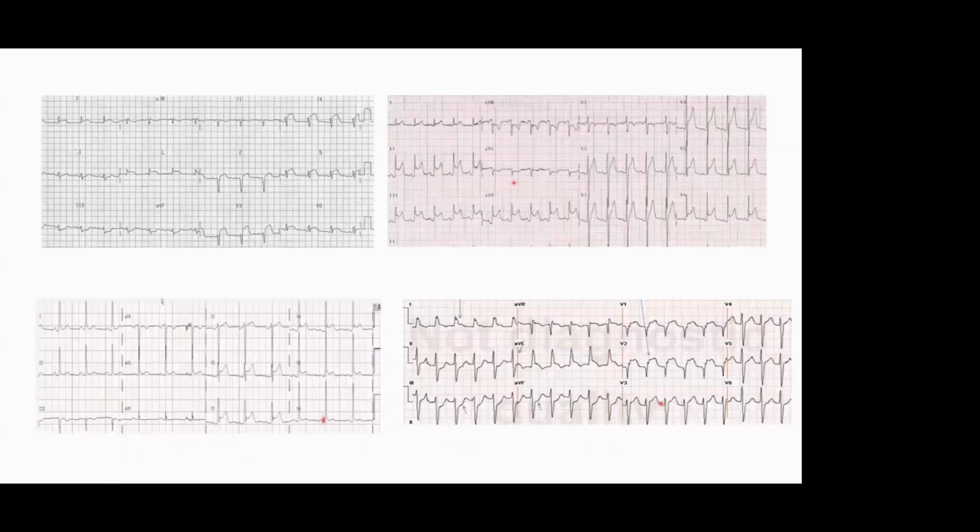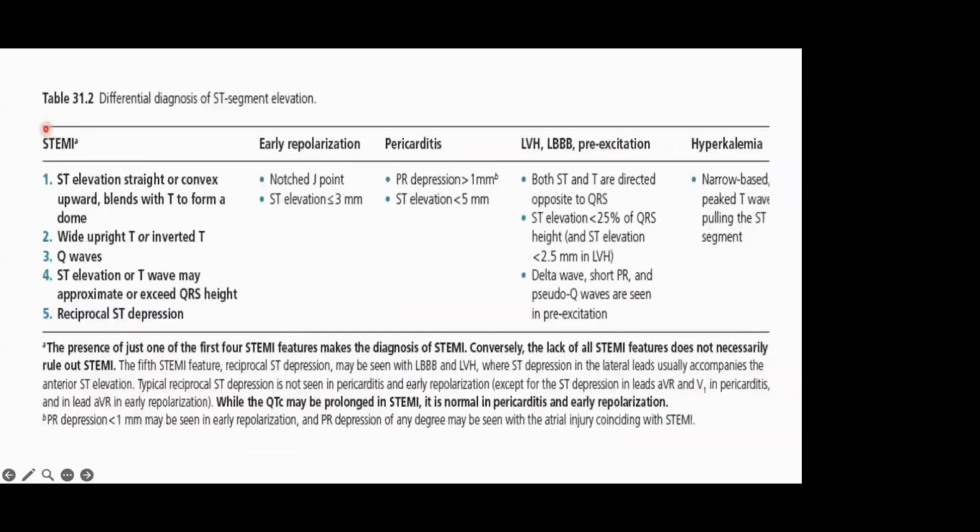I think today's discussion mainly depends on how to identify a ST elevation MI, and how to identify the mimics of ST elevation MI in different scenarios. So first, we'll go to the ECG.